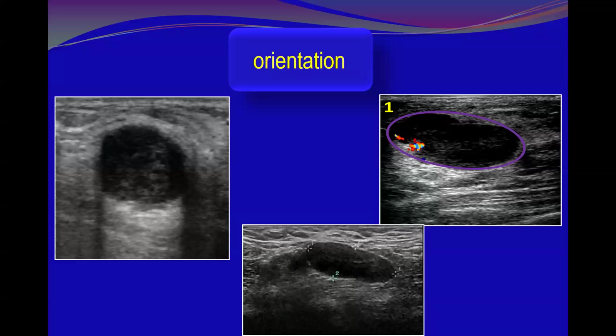No, we are talking about the oval-shaped ones. Excellent. Parallel. Agree with you. Why parallel? Because the angle is closer to parallel. Excellent. Well done. Yes, you are right. Because they are still closest to the parallel, not toward the anti-parallel. If we draw the angles, as she said, it is closest to parallel. And what about this one?